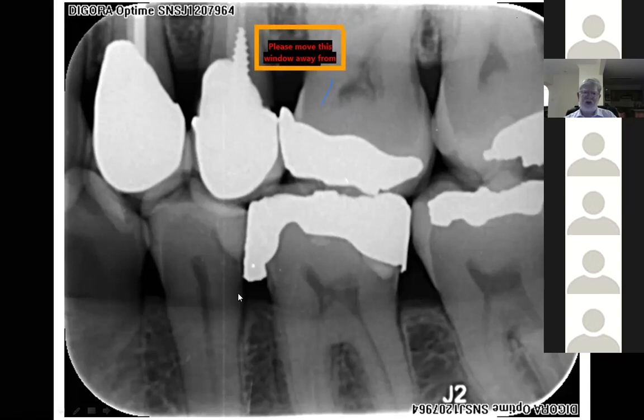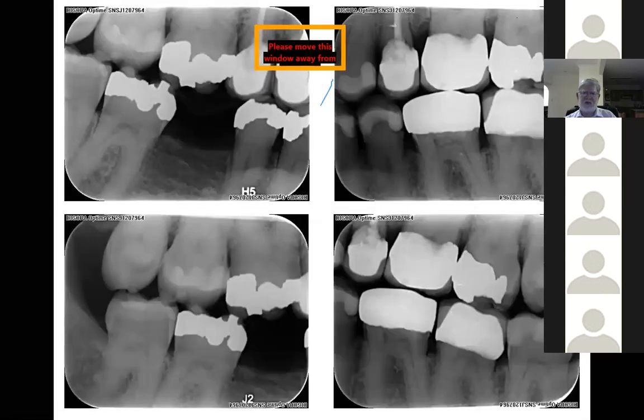You're going to shred the interdental papilla trying to do anything there. Here, with a burr and retraction cord, maybe. But why? That's the thing. Why? You have restorations that have been successful. There's no bone loss going on. Everything's fine. Absolutely no harm in this particular patient in sitting on the sidelines and monitoring.